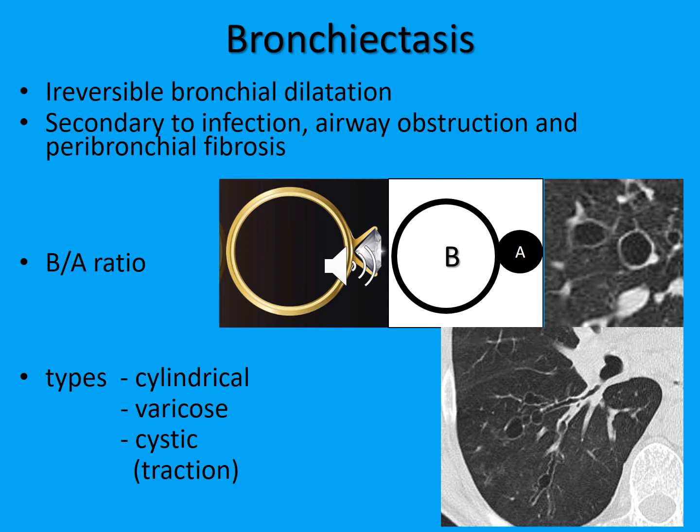On imaging, we assess bronchoarterial ratio, where we compare caliber of the bronchus and adjacent branch of the pulmonary artery. If the bronchus is significantly dilated, we can see a signet ring sign. There are different types of bronchiectasis, including cylindrical, varicose, and cystic. You can also hear a term traction bronchiectasis that doesn't represent bronchial dilatation related to inflammation but to fibrosis.